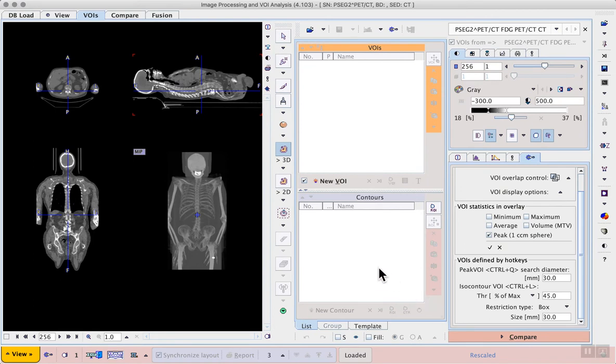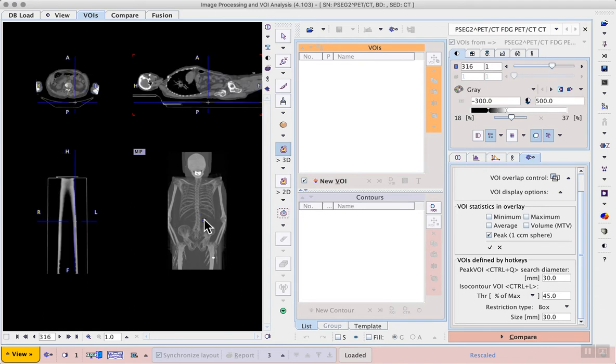First of all, we'll explore the image a little more to understand where we need to be careful not to crop the image artificially. If we see the MIP, this suggests that at the level of the elbows the image will be the widest, and there's already been some cropping in the acquisition.